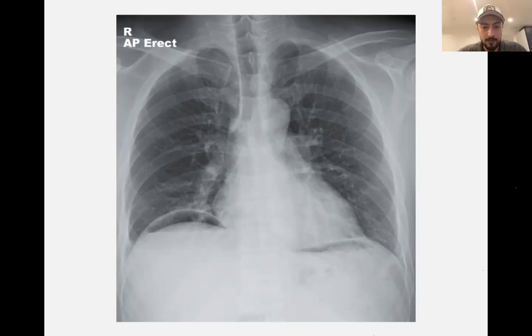Okay, well done. That's a good try. So you spotted the abnormal finding, the obvious one, which is pneumoperitoneum. So pneumoperitoneum, as you know, is basically when air starts building in the peritoneum because of, for example, perforation in the stomach or the intestines, and starts building up below the diaphragm, and so it looks like that.